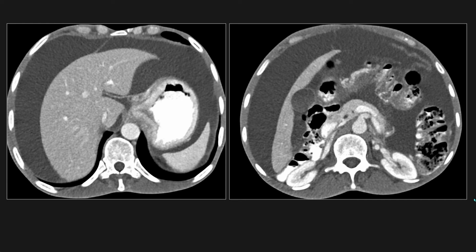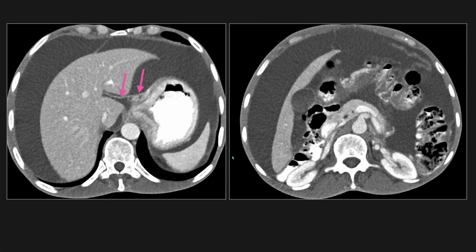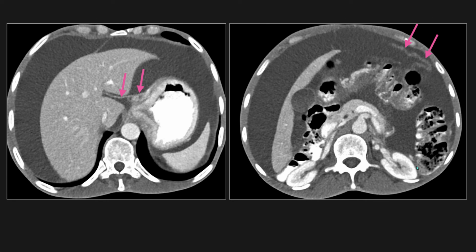There is soft tissue thickening and nodularity outside of the gastric wall, which helps us. This is creeping along the gastrohepatic ligament here. And what do we make of all of this ascites? Yes, the omentum in the left upper quadrant. This is thickened with implants flapping around in the ascites. Even this relatively subtle amount of thickening of the omentum is highly suspicious, so be sure to scan the entire peritoneal cavity carefully when dealing with cases of suspected gastric cancer. This patient has peritoneal carcinomatosis.